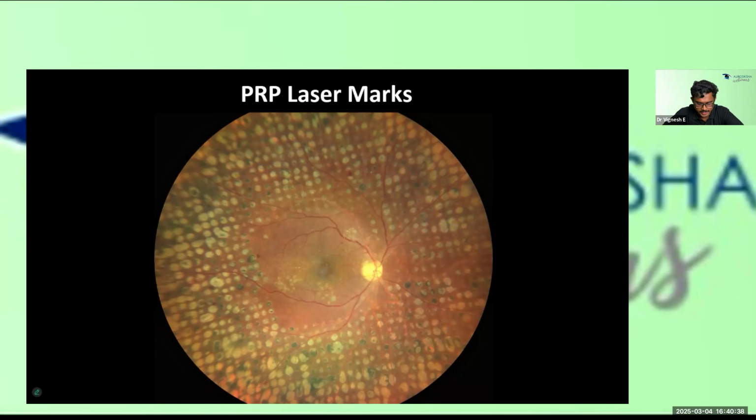So when a patient is diagnosed with high-risk proliferative diabetic retinopathy and is seen by an ophthalmologist, the ophthalmologist will advise pan-retinal photocoagulation. This is how a well-lasered PDR fundus should look. There are laser marks covering all the areas of the peripheral fundus. Only the macula is left unlasered. In this patient, the signs of activity of PDR have regressed, and this can be called a stable proliferative diabetic retinopathy post pan-retinal photocoagulation.